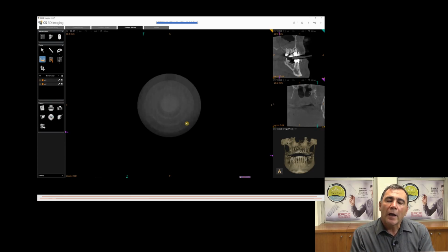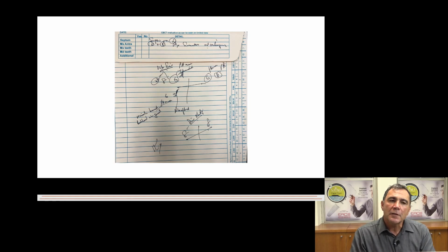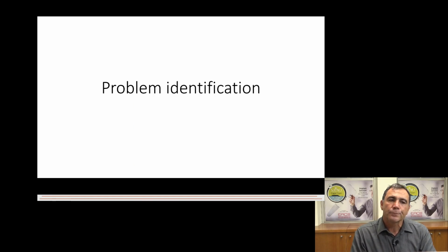And then I have gone through the whole image from superior to inferior so that I can make an informed decision of what I want to look at further. This is my normal shorthand of what I do whilst I'm doing that axial superior to inferior view, so that I can go back to each and every point and make sure that I do not miss out.